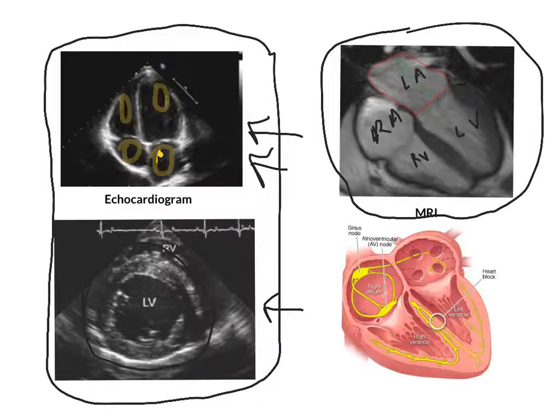Now, in my opinion, this was always completely backwards and very confusing to most people. In pediatrics, when I do pediatric cardiology, we flip this the other way so that it looks more like an MRI picture, or this anatomical picture down here. But it is the way it is for so many years because one guy decided that this is the way that they should look at it. So no one's bothered to change it. I don't know why. It doesn't make any sense to me at all.